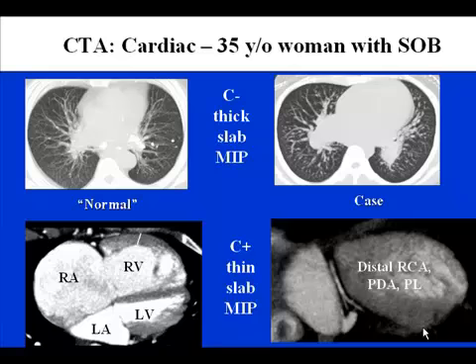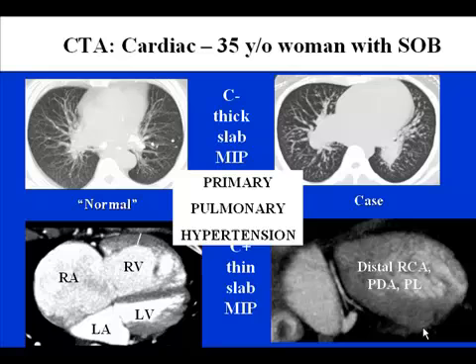So putting together the characteristics of clear pulmonary hypertension using classic findings and evidence of D-shaped interventricular septum, RA enlargement, and right ventricular hypertrophy, a presumptive diagnosis is obtained indicating likely primary pulmonary hypertension.